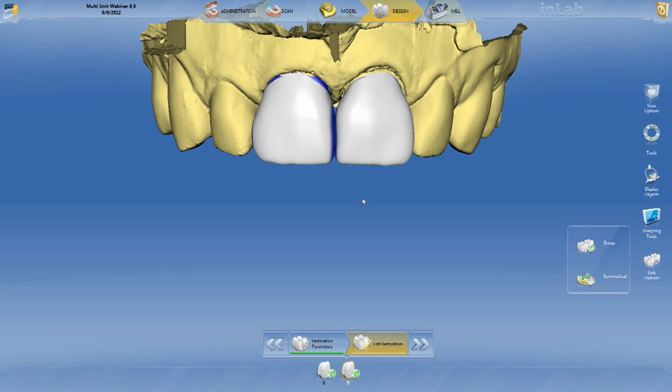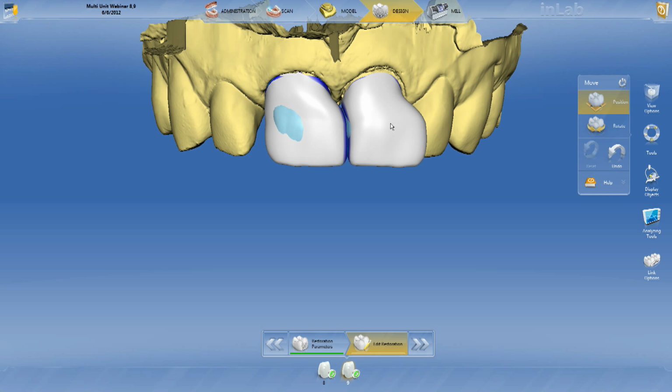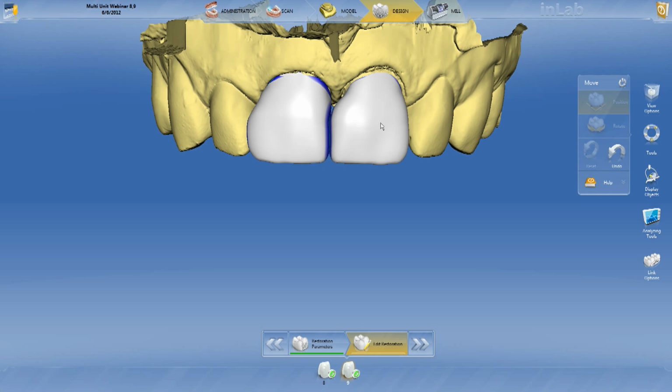One of the things I like about this is I don't use it that often. I only use it in certain cases. If I definitely want to, let's say, move something when I've been sitting here working, trying to get everything aligned, I can definitely move them both at the same time, make them longer. Okay. Make them shorter, move them around, do whatever it is I want to do with them. Okay, as you can see, they both do the same thing. So I definitely like that.